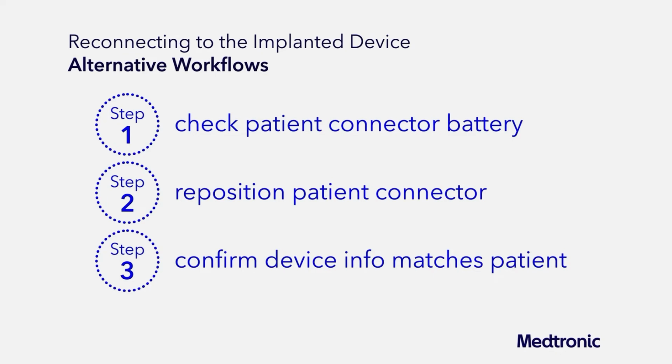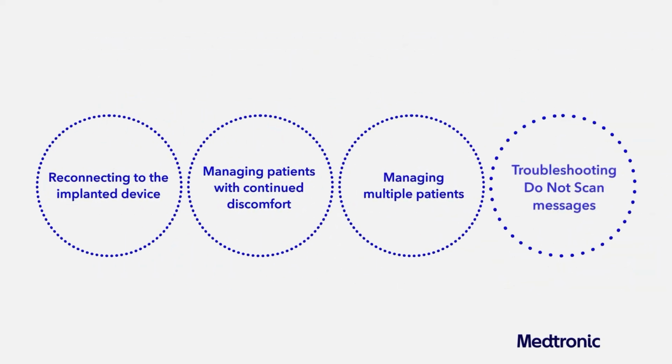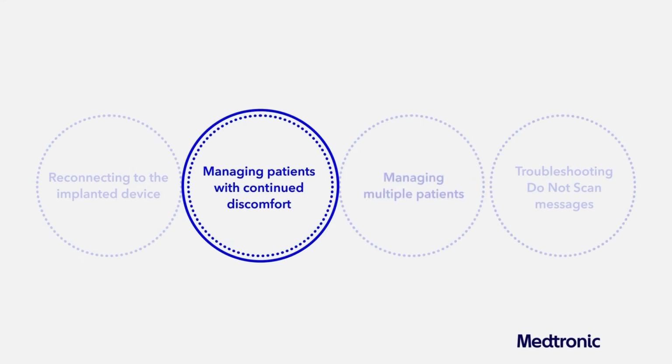Note, if the patient connector disconnects, you must end the session, then reconnect to the patient connector and start the session again.